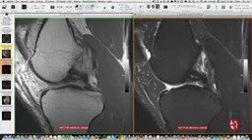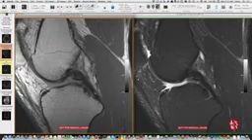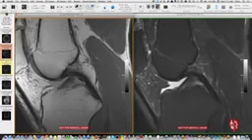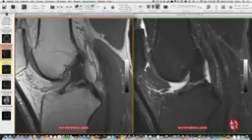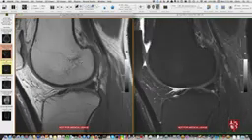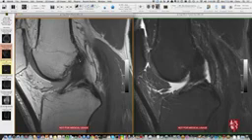We encounter this big, thick, black ligament there. That's the posterior cruciate ligament, right? And you have some of these meniscofemoral ligaments that cruise by. Here's the anterior cruciate ligament. We know that the femoral attachment site should be lateral because it's really flat right along the lateral femoral condyle. So if I go sweeping laterally, here's lateral, and here's that ACL coming off.